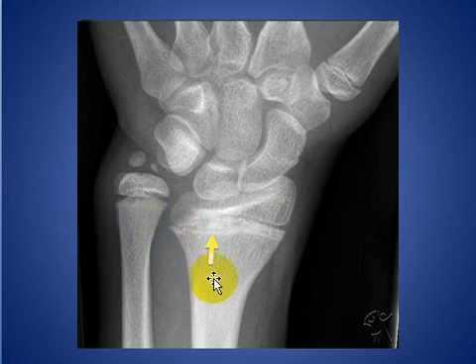Normally, the ulna and the radius should be the same, but here the patient has trauma, and we see here epiphyseal bar on the radius causing alignment disturbance and disturbance of the growth.